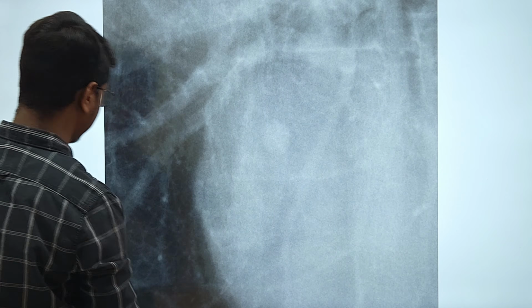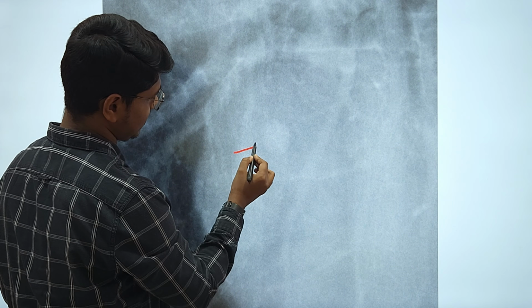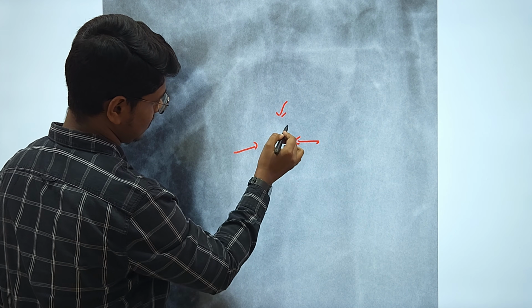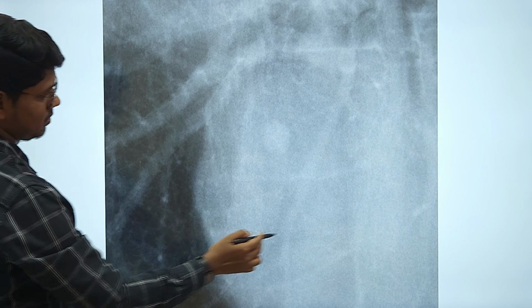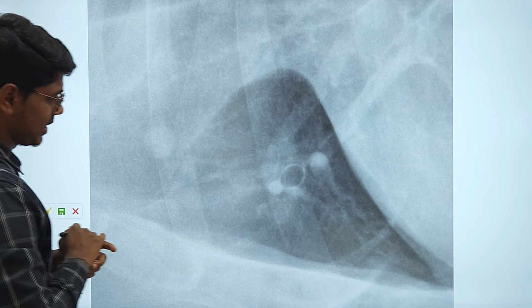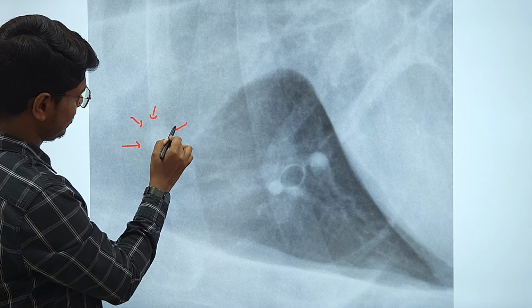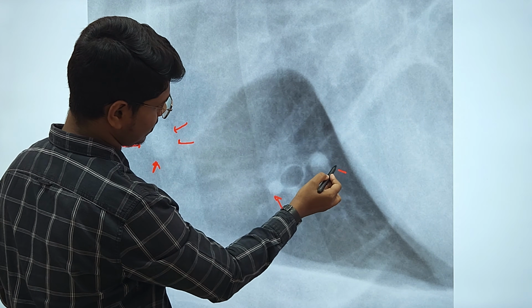Let us see some radiographs. Here is a radiograph. Can you see a pulmonary mass here? So just here, can you see? This one is the nodule. Another radiograph here. See this one. Here you can see a differential diagnosis. Here is a nodule. Okay, can you see a nodule here? It's a nodule. But can you see two more nodule-like structures here and here?